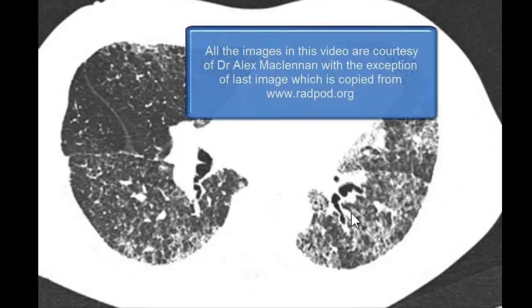So all the features mentioned so far, that is lung fibrosis, traction bronchiectasis, and the presence of perilymphatic nodules, are suggestive of interstitial lung disease. In this case, both the patients have been diagnosed with sarcoidosis. Please note that the first patient also has enlarged lymph nodes, which along with the presence of all the features mentioned before should make you think of sarcoidosis. Also note that the most common cause of perilymphatic nodules is sarcoidosis, although they can be present in other interstitial conditions.